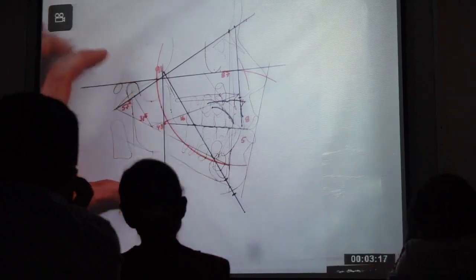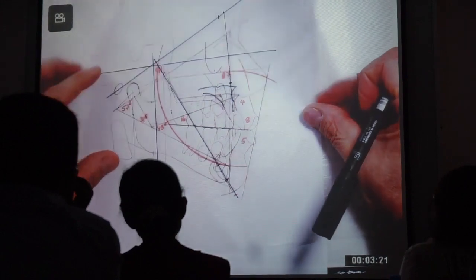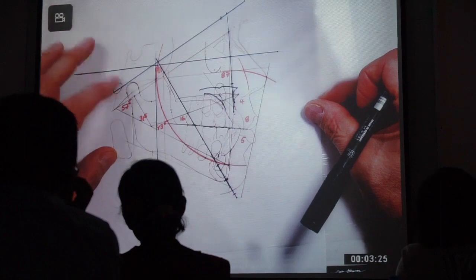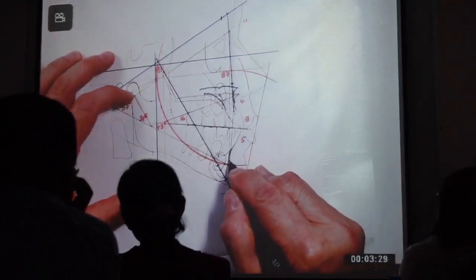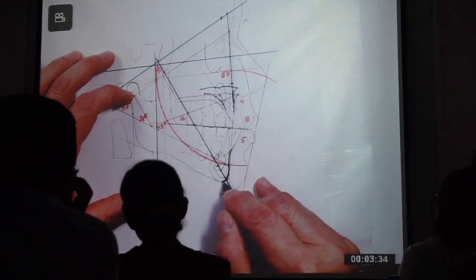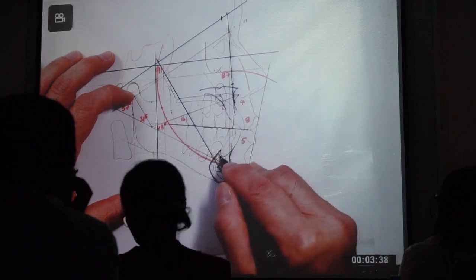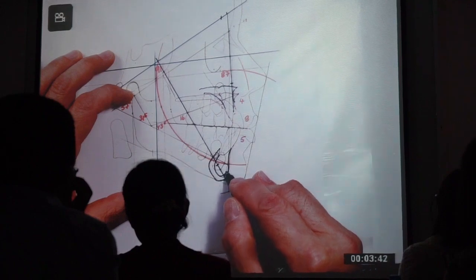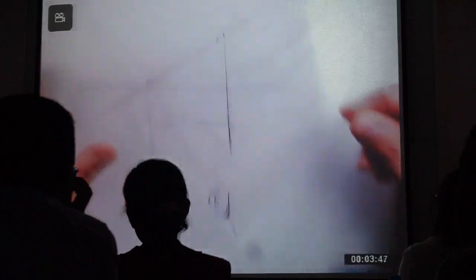Okay, now I go back with this sheet of paper. I trace it on the facial axis, and then at this new point I draw the new symphysis, the new chin. The chin goes down 2.5 while point A goes down 1.2.